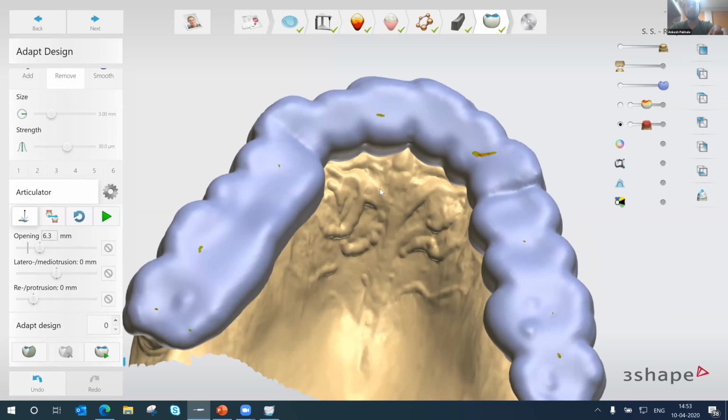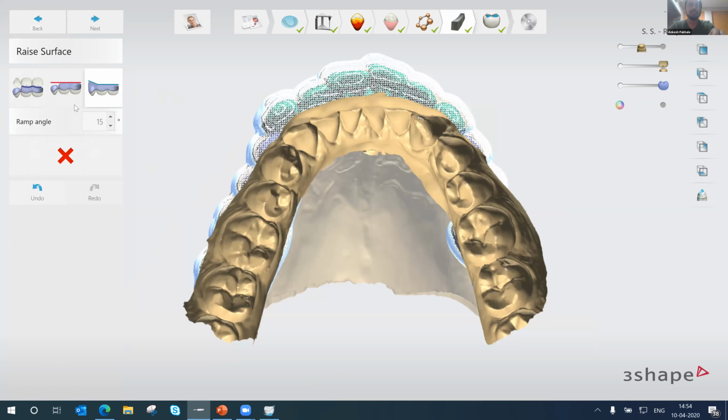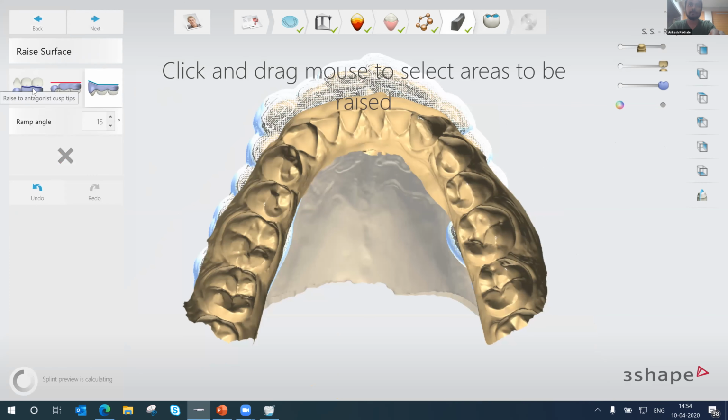But here again, for a few people who want to understand exactly what changes are taking place, all I can do is go back and increase my bite ramp, just to show if I use the middle portion and make some changes. I just undo all, and I would use the middle one, the base 20.